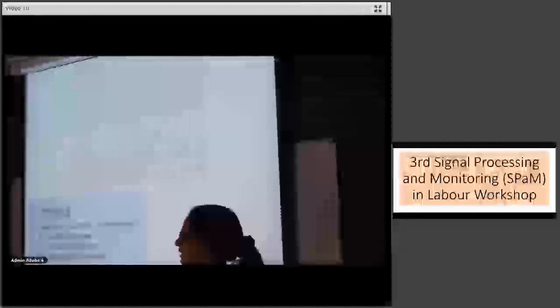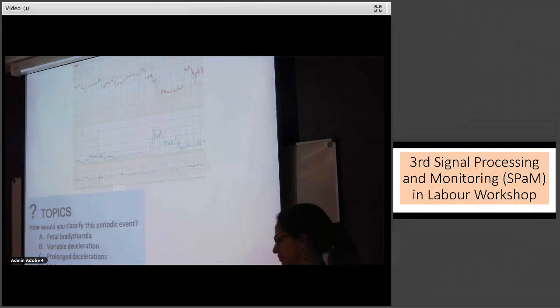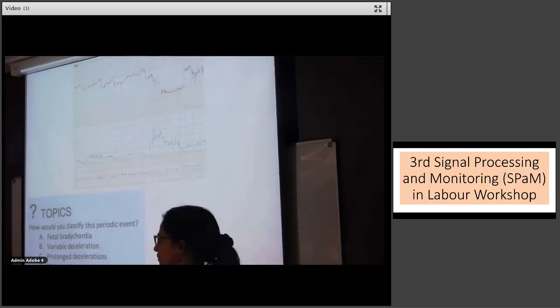I think that contraction seems a little unusual in its length and amplitude compared to the rest. Whether there's an examination or something with it, whether she's test pushing. Clearly, this is vulnerable presumably when she's going to push, and you need to watch out for that. The baby looks like it's going to recover. Right. Austin, would you like to add something? Yes, I agree with both comments. The only thing to add is, have you got a point? Yeah.